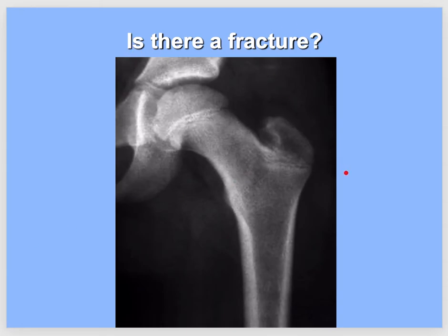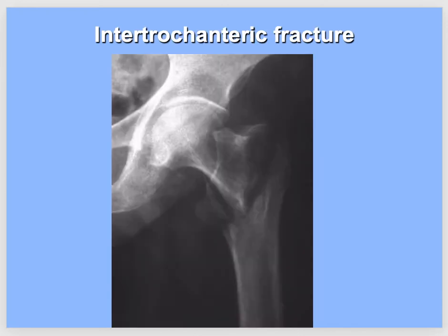So is there a fracture? So there's a fracture here that you can see. It may be one of those that it may not be a fracture as well, because if you think about it, the way the bones form and the epiphyseal plates, this is an epiphyseal line, this is an epiphyseal line. This looks like it could be, but the displacement of this line, to me, makes it look like this here is a fracture. So just kind of visualize that. Look back on your PowerPoint and see the difference in those lines.